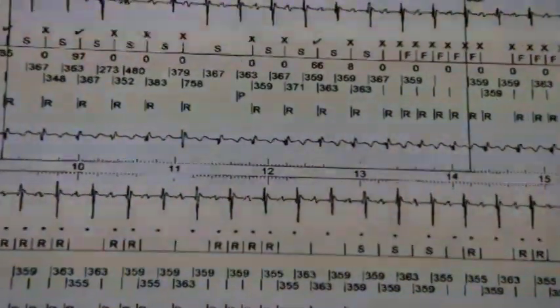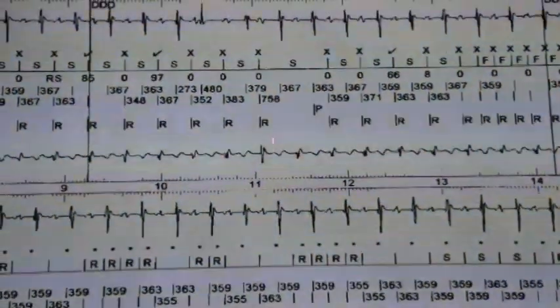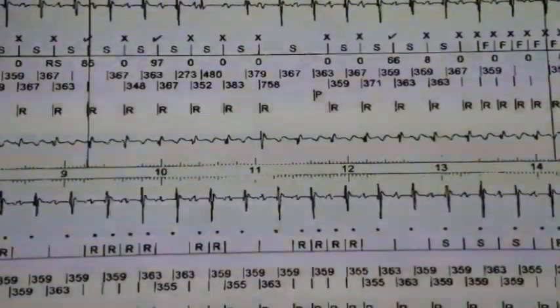The T waves are nearly the same size as this R wave. So if we hide the T wave, we will probably hide an R wave. And we're already not sensing some R waves, okay? This is an R wave that's not being sensed, really because of this signal here. This signal made this not be sensed. It's normal. We can see this sometimes, okay?